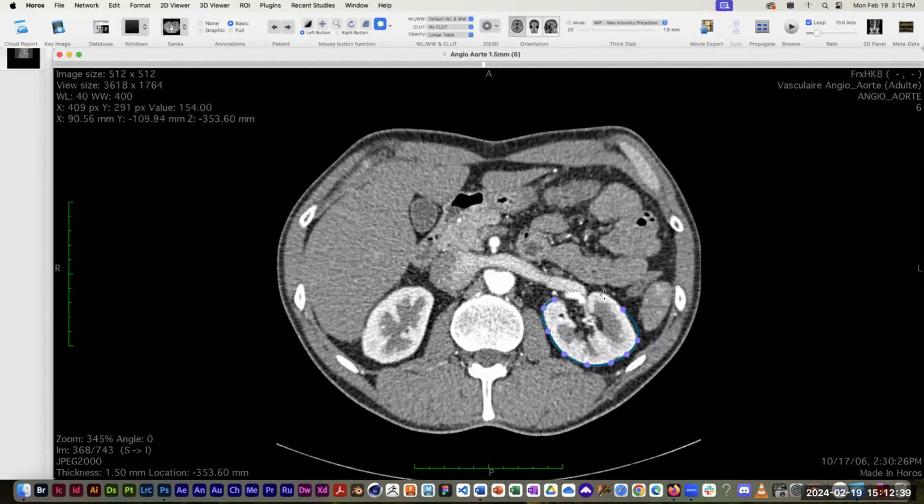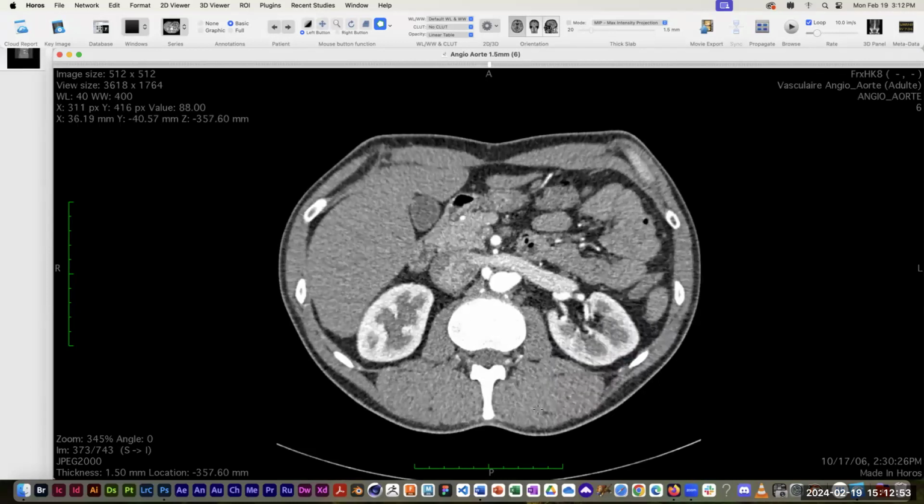Similar to the last thing, you're just drawing with the pencil. Pretty much, yeah. There is going to be one difference in just a minute that is going to allow me to fill in the missing ROIs. So I'm skipping over, only doing every fifth slice, and it'll actually generate the missing ones.